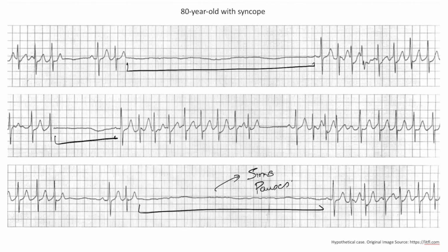Notice how after the sinus pauses, you have these episodes of increased heart rate. So the heart rate is now higher, and it's pretty difficult to see any P waves in this area. So this would be an example of junctional tachycardia.